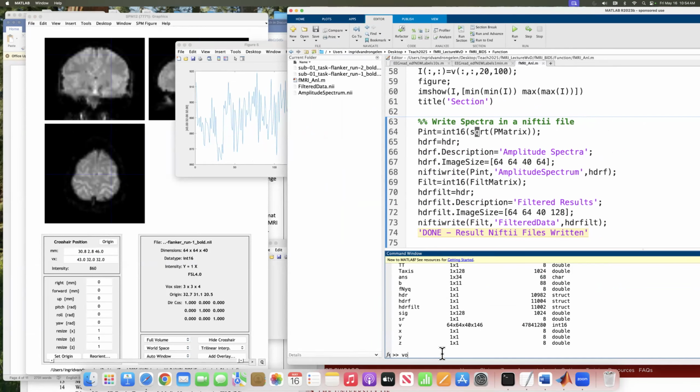My voxel is going to be this time series, and that is going to be the V, which is my volume, and now I'm using the same values, 32, 32, and I'm going to take all the data here. I'm just using this command to make a section in my volume, and I'm putting it in a voxel, and this one should be here. So I think this should do that.